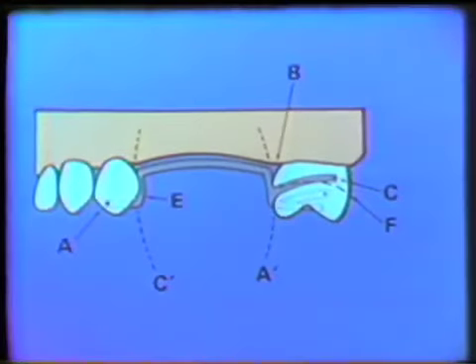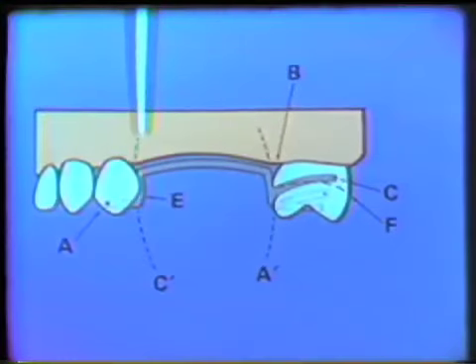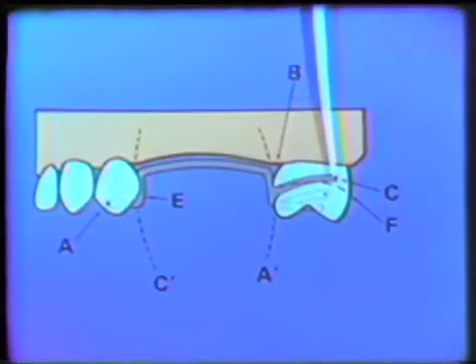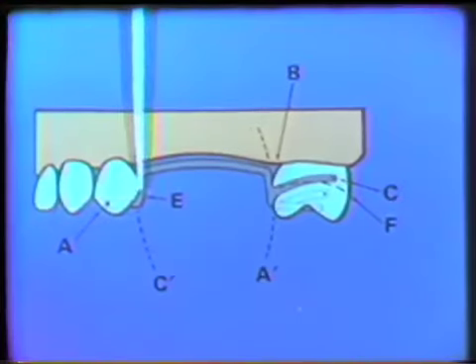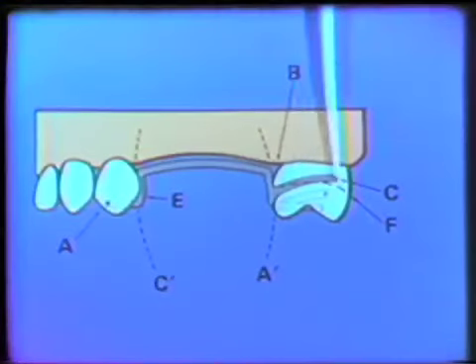Once the framework is fully seated, displacement of the anterior minor connector would have to occur along arc C', when the center of rotation is the retentive tip of the molar clasp. It is evident then that the anterior minor connector and rest cannot be dislodged without first releasing the molar clasps.